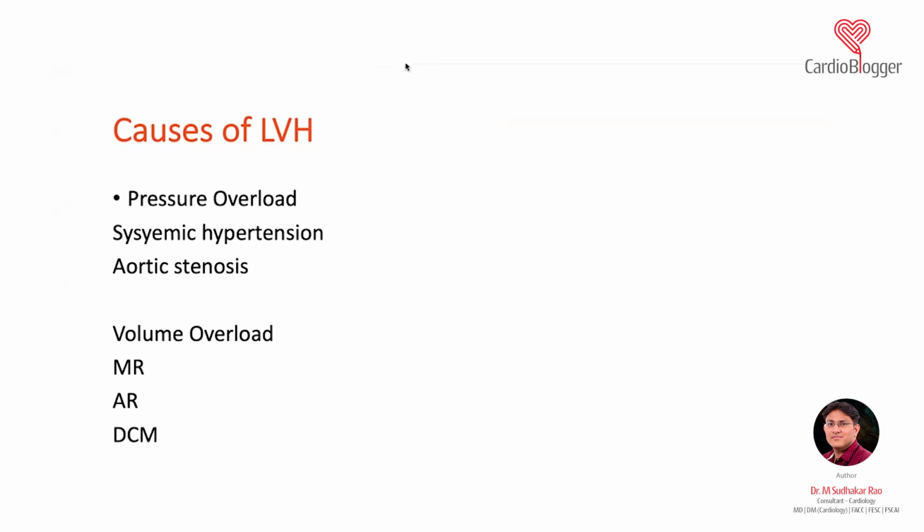So what are the changes in ECG in case of pulmonary hypertension? As I told you, pulmonary hypertension is one thing which first involves the right ventricle. So it produces right ventricular hypertrophy on ECG. In right ventricular hypertrophy, the first thing you have to see is R in V1 more than 7 mm, or any features of right ventricular hypertrophy like right axis deviation.